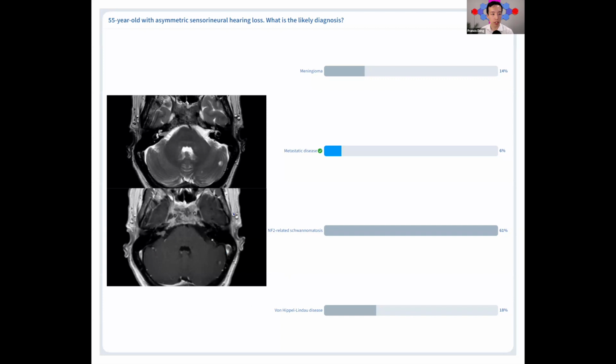in the cerebellum, such as here, corresponding to a T2 hyperintense lesion that's partially contrast enhancing in the left cerebellar hemisphere. And there's also other tiny foci of contrast enhancement elsewhere that have a T2 correlate, so you know that they're not pulsation artifacts, on the right as well. So this is multifocal leptomeningeal metastatic disease, as well as cerebellar metastases.